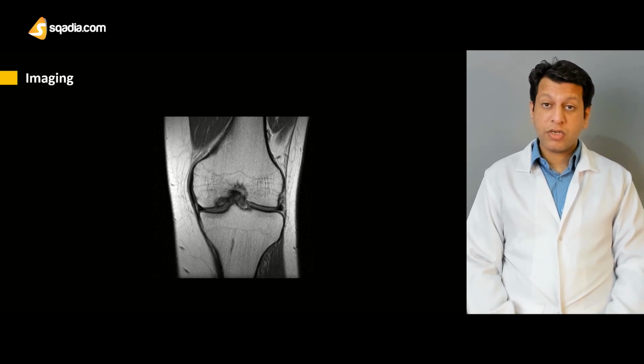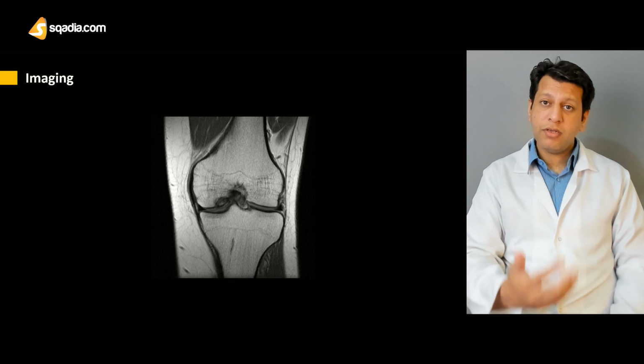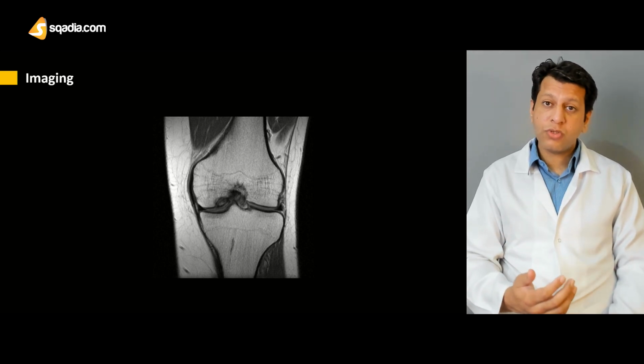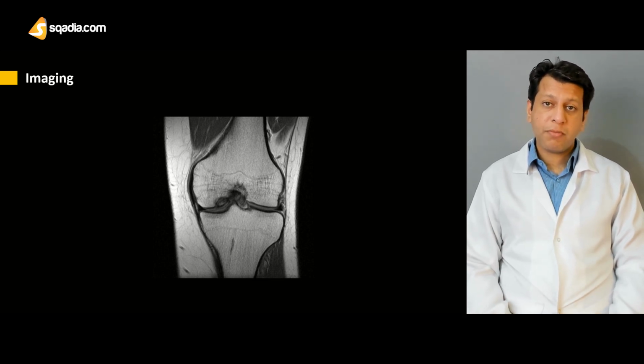Therefore, you have to look at the medial femoral condyle clearly, and there may be a gutter-shaped or crater-shaped lesion on the posterior lateral aspect of the medial femoral condyle, which may present with increased sclerosis. You can also appreciate that there may be osteochondral bone which has separated out of the normal condyle.